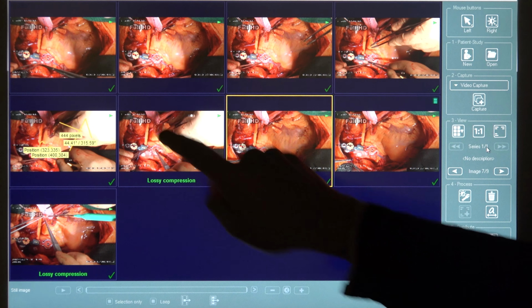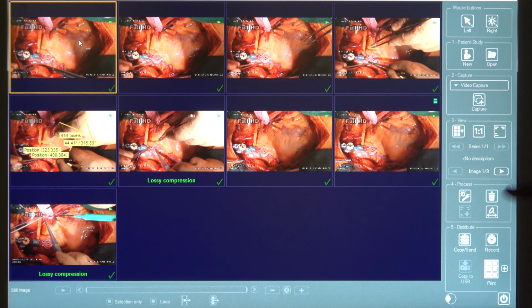The fourth category includes an assortment of images and video editing tools for customized viewing. Clicking the first icon, embellished with a wrench and sun, will provide you with the ability to utilize tools for calibration, color balance, and levels.